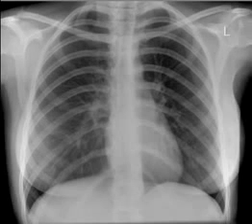Let us try and polish our skills again about radiological features of a normal chest X-ray. First of all, a radiologist will confirm identification, name, age and sex of the patient. These patient details are provided on the film or on the reporting screen. In this example, of course, these identification details have been removed to keep the patient's privacy. The details are matched with the details provided on the radiology request form to make sure that the report is provided on the correct film and for the correct patient.